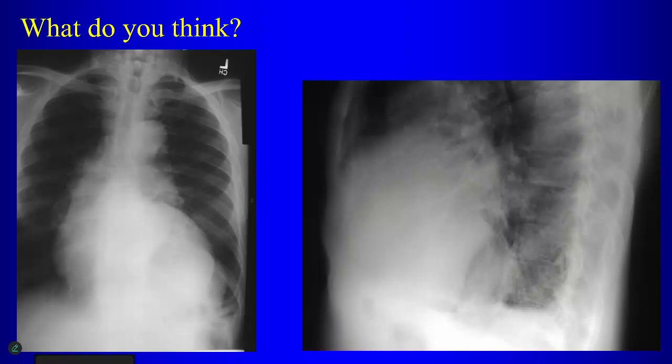Is there anything abnormal about the cardiac contour? Yeah, so there's enlargement here along the left ventricle, right? But there's also this funny looking bulge, right? See that bulge? And on the lateral view, here it is, right? Left atrial. Well, so if I tell you that the patient has a history of infarct, and there's a bulging here related to the posterior wall of the left ventricle.